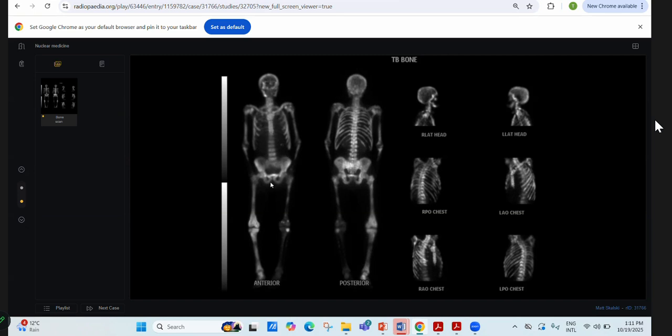That's why it's a super scan, and when there is less to elaborate on the image, then try to give the examiner the idea that you know your subject by explaining and giving the three, four differentials in which a super scan is seen. Do you understand what I'm saying? Four or five differentials of super scan should be on your fingertips, and then you narrow down to prostatic cancer.